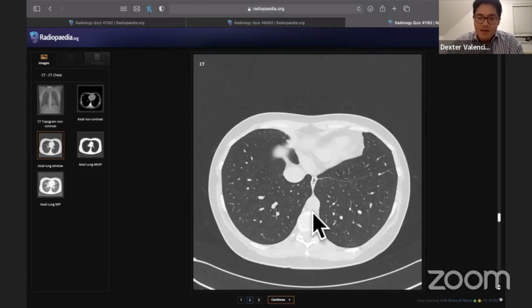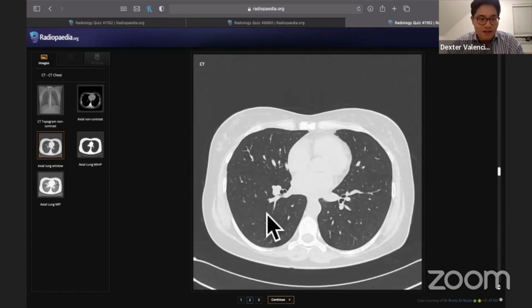And what about surrounding the lungs? So normally, in a normal lung, there would be a pleural space, and in normal patients, there'll be a teeny bit of fluid for lubrication, but you shouldn't be able to see it. So here we can't actually see the pleural space. We assume it's between where this lung ends and where these ribs are starting, so that chest wall. So that's where the pleural space would be. It runs all the way around these areas here.